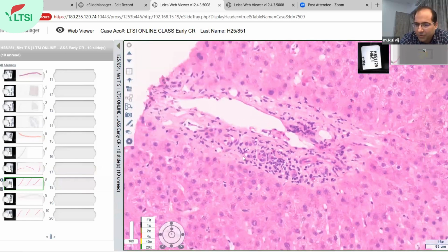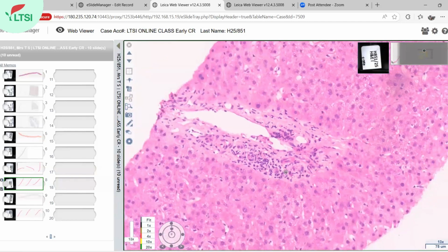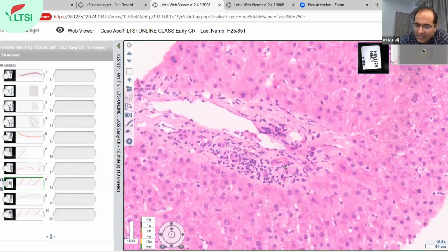This is so much better, though. Yes, so much better. There was so much lobular inflammation which appeared. There was so much expansion of the portal tract. You said there was piecemeal necrosis there. Yes. You said there was interface hepatitis. Everything is gone in this biopsy. Yes. So I would say that this is so much better.